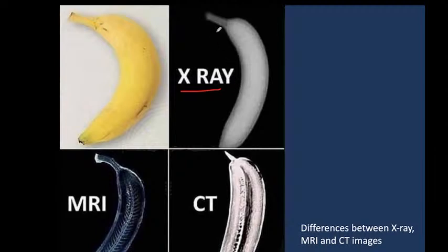All right. There are more internal details on the CT scan image here. We see some internal structure, but not very clear. But the best way, the maximum number of structures is distinguishable by MRI examination. That explains why MRI is becoming more and more popular for examination of internal organs in clinic.